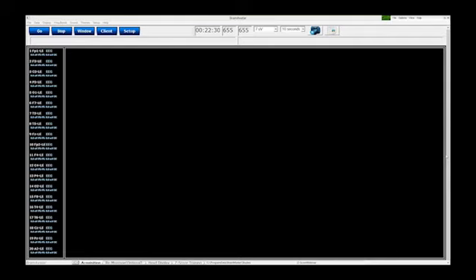Debbie, all right. When using head map voxels, can you choose sum? Yes, you can. Sum is an interesting band, and I'm just going to say it like that. Sum is basically a wideband, and you're sometimes going to get really high numbers out of it. Yes, you can choose it. I don't recommend it for training. The sum band might be a little bit higher, but absolutely you can use it on the head map. I would not use it for training, though.